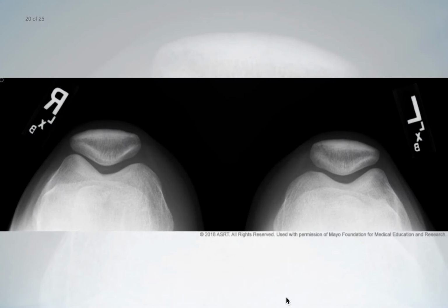The following quality criteria are used to determine if a tangential patella radiograph has been produced with proper positioning and technical factors. Collimation does not obscure relevant anatomy. The patella is seen in profile, and the patellofemoral joint space is open. The medial and lateral femoral condyles and the intercondylar sulcus are well visualized. There is adequate demonstration of soft tissue and bony trabecular detail.